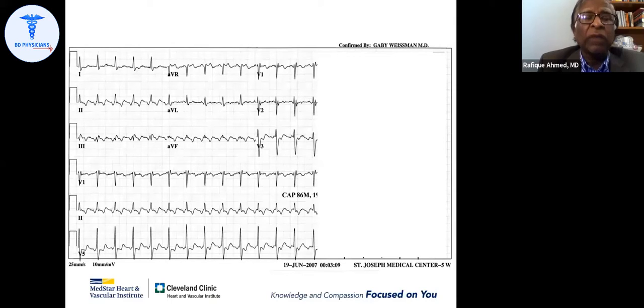The heart rate, I'll tell you, it's about 135-40 beats per minute. So this is definitely tachycardia.